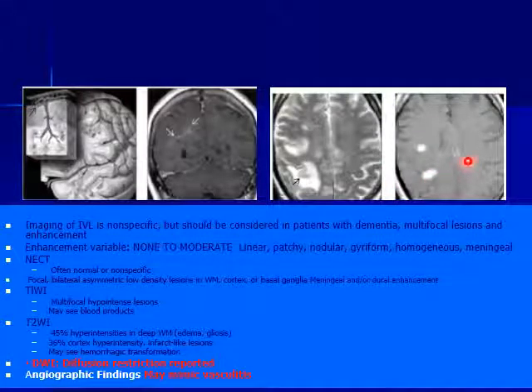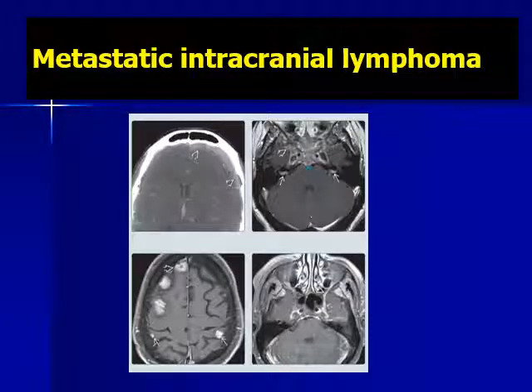Okay, punctate enhancement or linear enhancement, simulating vasculitis as if the vessel is inflamed, but it shows enhancing tissues and restricted diffusion. Okay, it shows restricted diffusion, and on angiographic studies it may mimic vasculitis. Put in mind that lymphoma in the body outside the CNS may send metastasis to the brain.